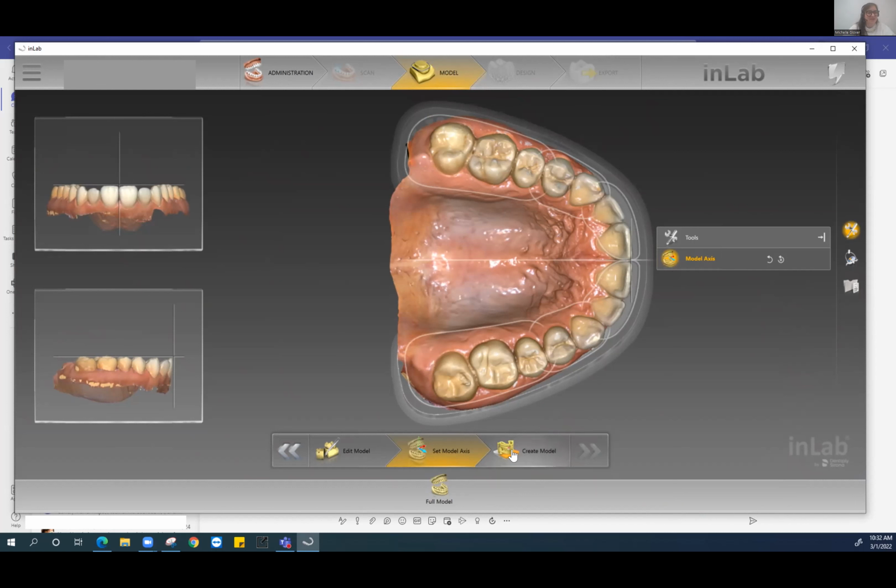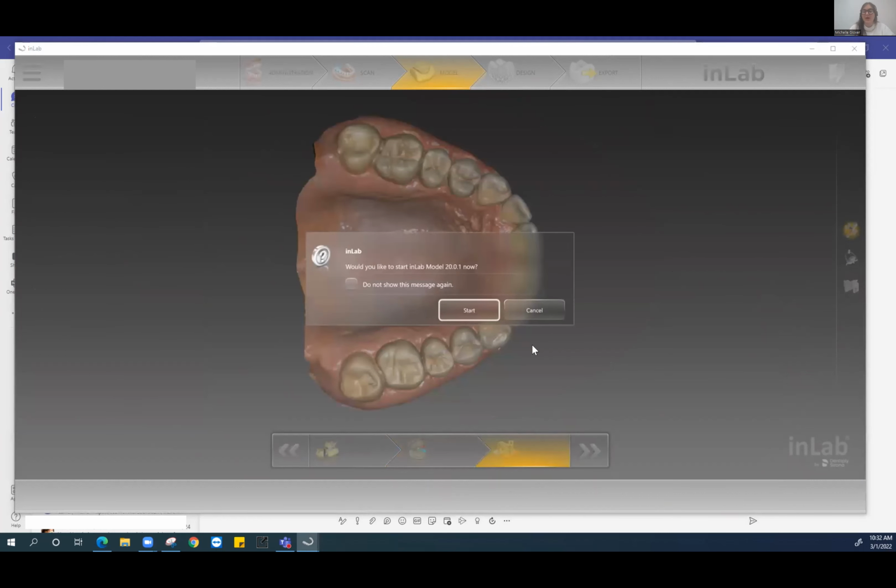Now, what you're going to see here is the option that says create model. What I was mentioning to you is you have software like the Splint application, model builder application, and partial framework application on your desktop. However, you're always going to get to all of them through this CAD software, the design software, because it's going to bridge any details. So any changes that I made to this model are going to now transfer over to the model builders because it's a bridge. The CAD application acts as that bridge to share the data with the application itself.